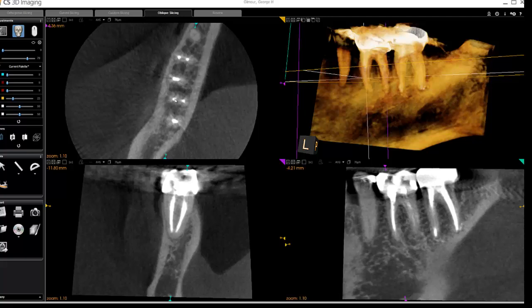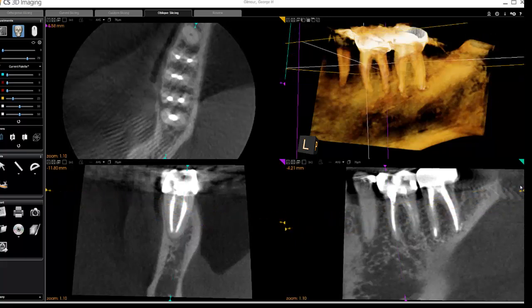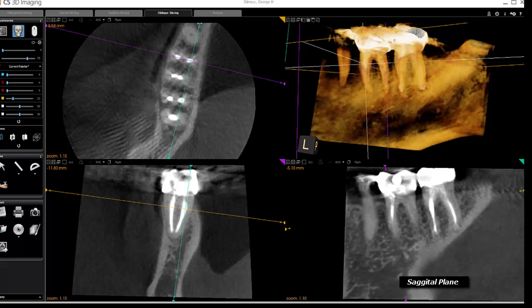Okay, as we go up into the furcation area, it's not quite apparent that there's a radiolucency, but on this sagittal section, when you look on the lower sagittal section, toward the lingual, there is some bone loss in the furcation. It's a radiolucent area. You can presume that radiolucency indicates some incipient furcation bone loss.